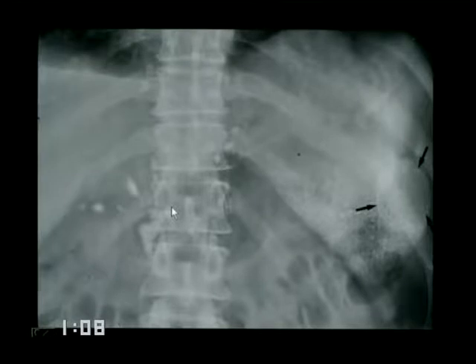This is an old case actually reported by Arnie Friedman, a patient with thorotrast exposure, and you could see a very thin lace-like pattern. It's actually hard to make out the lace-like pattern, but you could show the general increase in density over the liver, the general increase in density over the spleen, and then you could see these very, very dense little foci representing nodes in the peripancreatic distribution with some lines representing lymphatics.